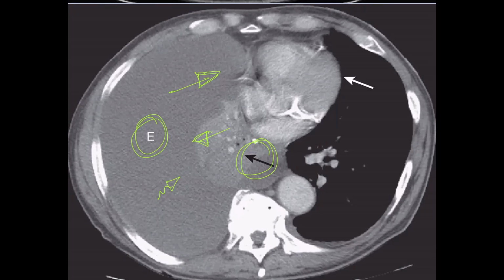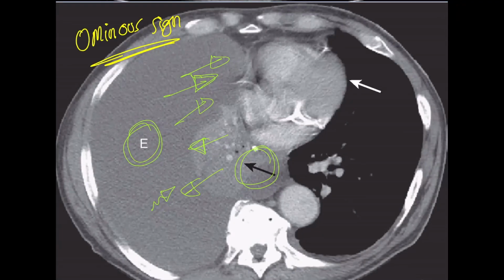Or you might argue that the cardiomediastinal structures are more pushed rather than pulled because of the huge size of the effusion. But there is a combination of 2 opposing pressures: the pushing pressure by the pleural effusion and the pulling pressure by the atelectasis. The presence of a combination of atelectasis and massive effusion in a patient, especially if a smoker, is an ominous, severe sign and raises a concern about bronchogenic carcinoma in a patient with a smoking history.